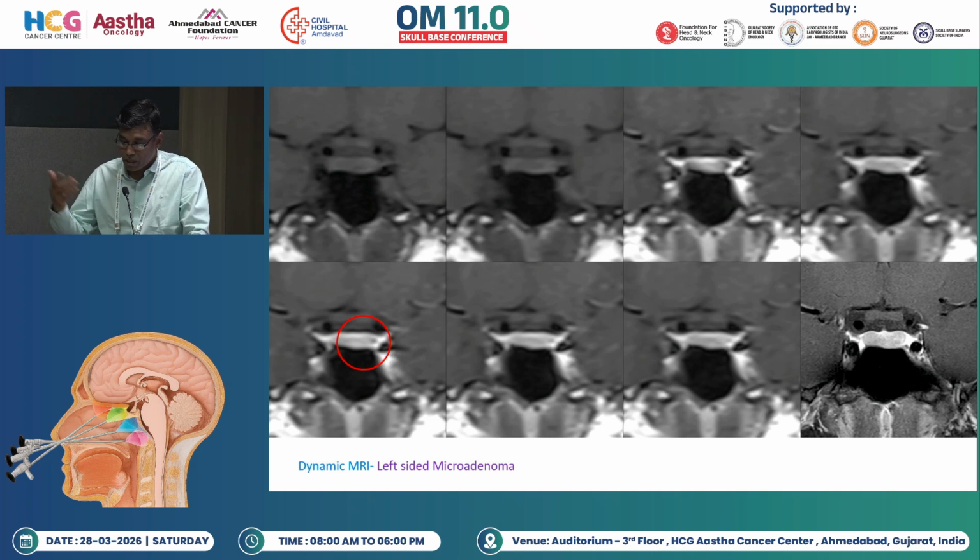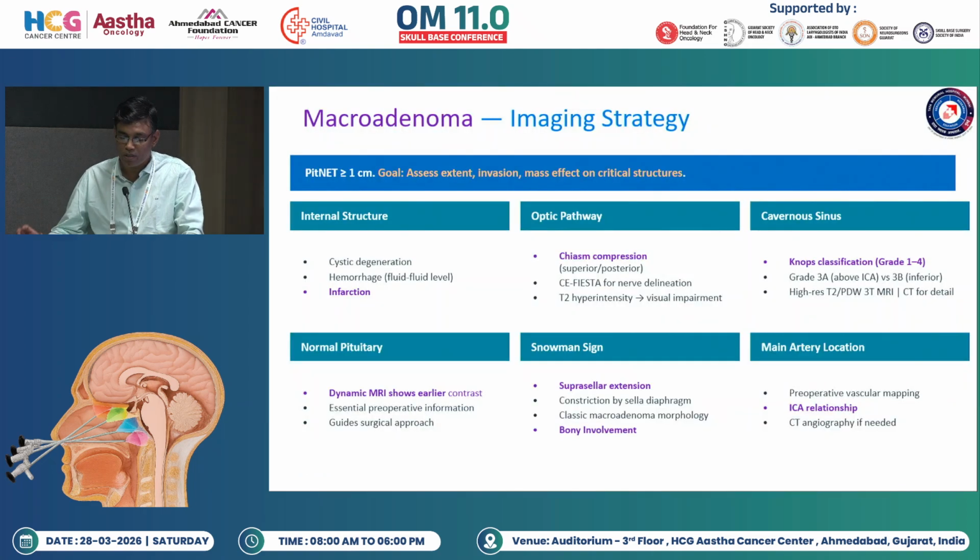And the moment we acquire the spin echo sequences later on, it again merges with the surrounding tissue and it is difficult to localize. So it is very important that we evaluate microadenomas with dynamic contrast enhanced imaging.